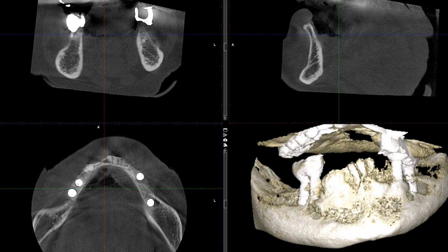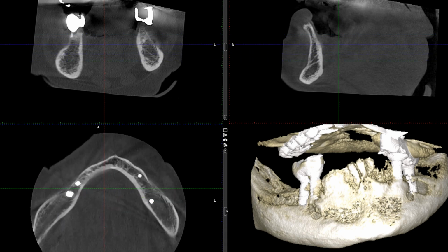In today's video I would like to show you a CBCT scan of a patient who is 80 years of age. Just from our background or medical information that we know, as we age, we tend to lose the overall bone density and often are diagnosed with osteopenia or osteoporosis. In this particular patient, what I have noticed is that there is a significant loss of trabecular bone density in the posterior mandibular region, and I would like to show that over the next minute or two.